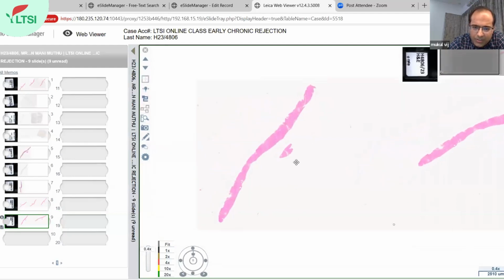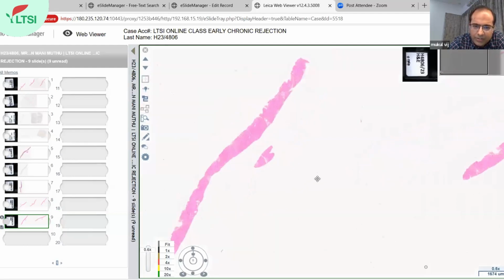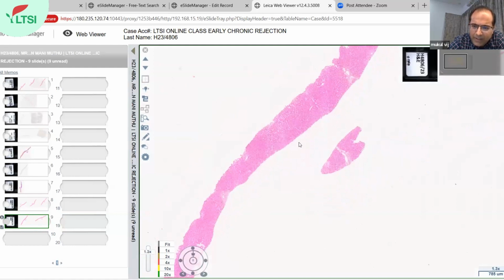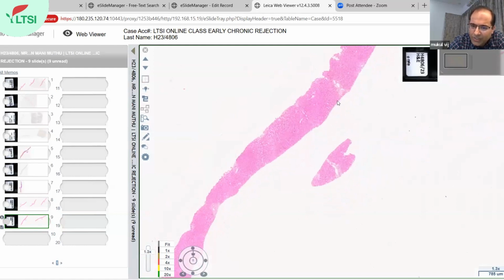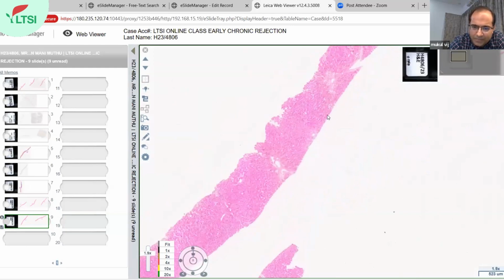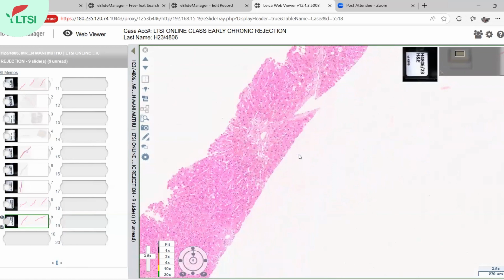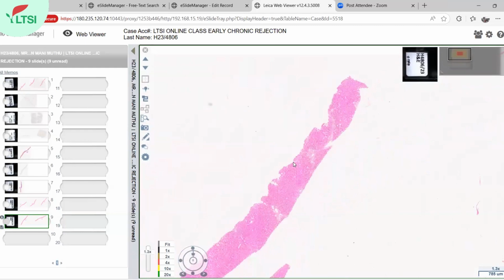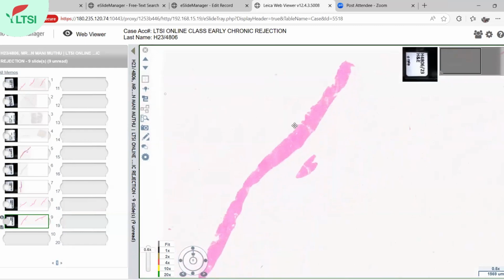Okay, so I'll show you the liver biopsy. Okay, so this is the core. This is again a nice core here. You see this liver biopsy, and not much blue areas, mostly pink areas. Some pale areas you can see, definitely pale areas. So we'll see in the high power what are these pale areas. So this is a real surprise that somebody who stopped immunosuppression for 1 month doesn't have intense inflammation in the biopsy.